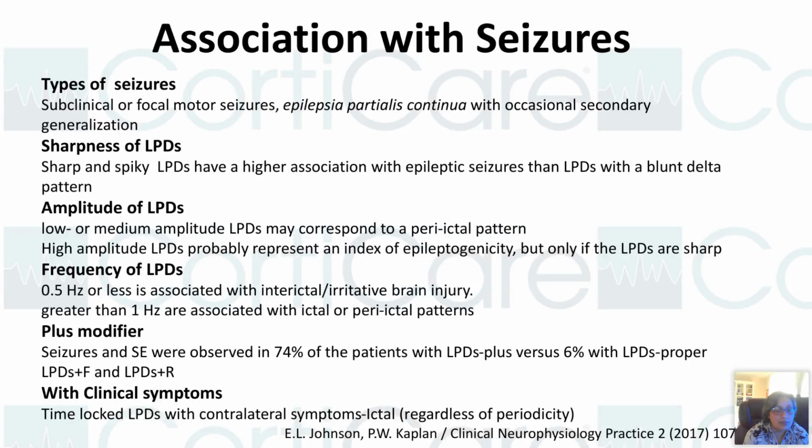LPD plus F, LPD plus R, 1 hertz is ictal. With clinical symptoms, when the LPDs are presented, they are time locked with a jerk or a twitch. They are ictal regardless of their periodicity.